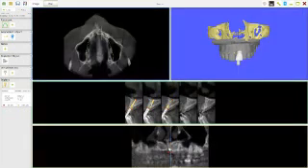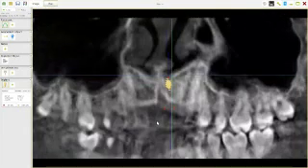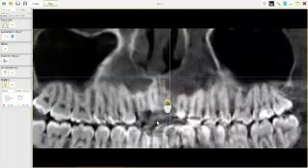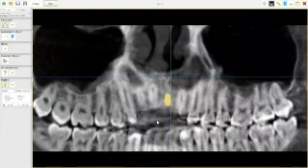So now we've positioned it. If I go back to here and I scan, you can see the implant. You can't see the whole implant as before because the implant is tilted, it's angled. So as you scroll through there, you're seeing different bits of the angle.